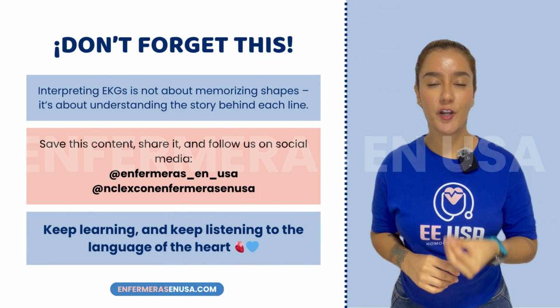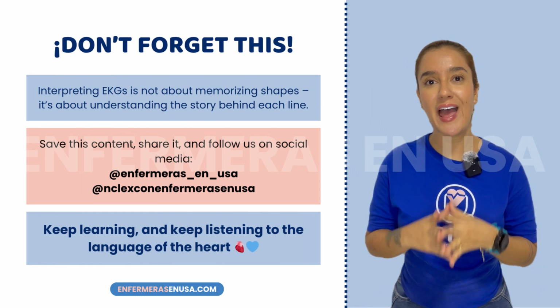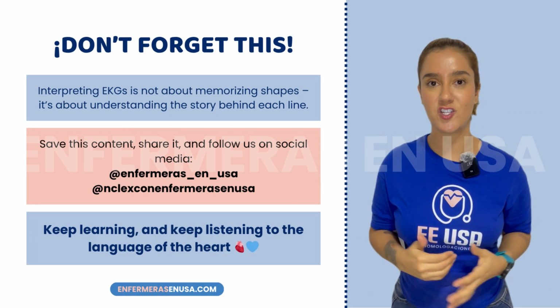Finally, remember, the more you observe EKG tracings, the more natural rhythm identification will become. It's not about memorizing, it's about understanding the story behind each line.